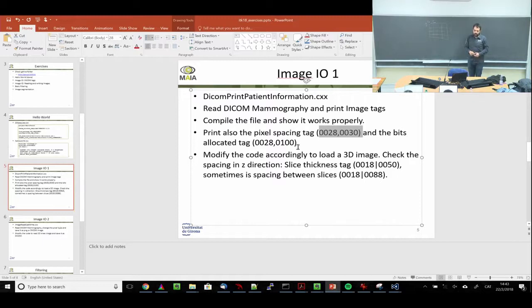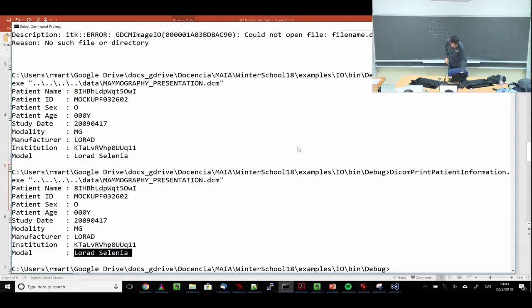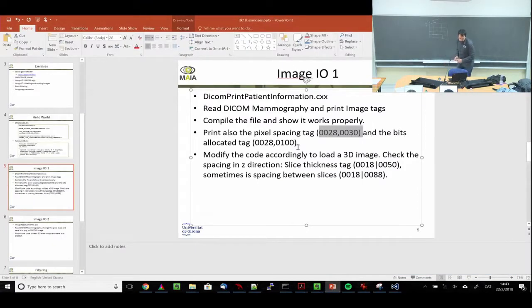Okay? And it's given in what? Meters, for instance. Okay? Kilometers. Or normally in DICOM tags they are in millimeters. Okay? So you can check. That's what I am asking you. But it's not here, obviously, because that's what you need to provide.